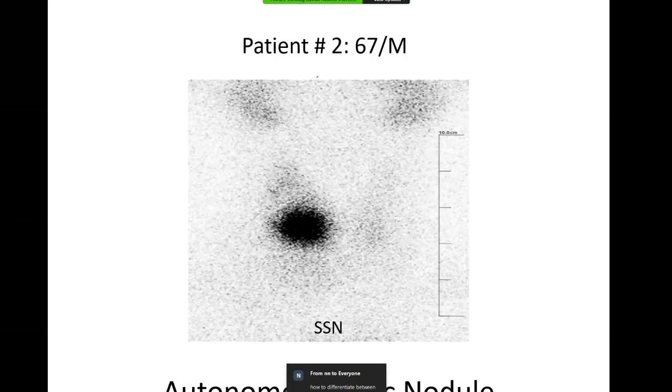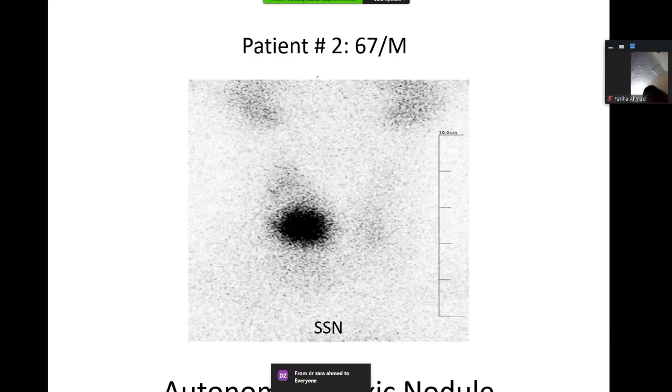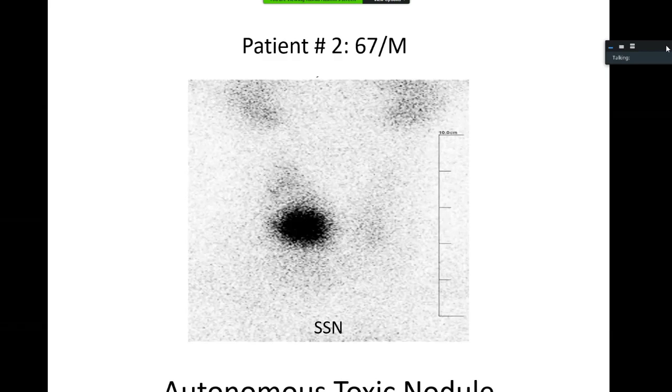so, so sorry, I could not get your question. What treatment is he taking already, So or what you are would be the asking what? treatment of choice for this patient's hyperthyroidism? Sir, sir, lobectomy. Sorry, this particular nodule. So no, this patient would be an ideal candidate for radioactive iodine 131 ablation therapy.